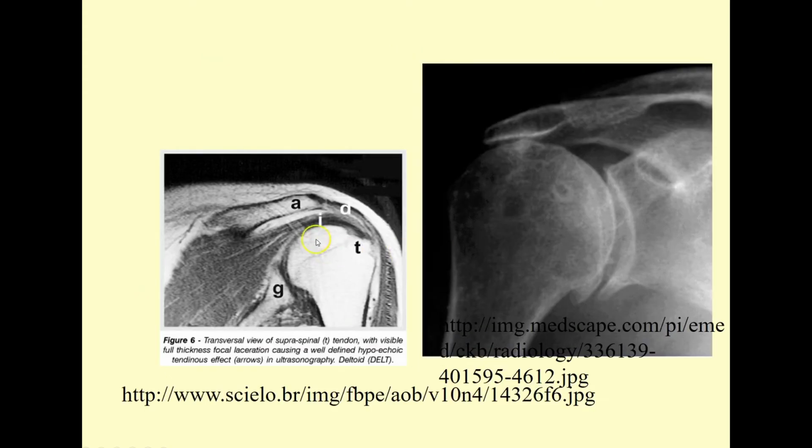Again, here we have an MR image. We've got the acromion here, we've got the deltoid here, supraspinatus coming through here, glenoid, and look at the offset. Here's the inferior part of the humeral articulation. Here is the inferior part of the glenoid. This is cephalad, and that's closed down, compressed. These are the conditions typical of impingement syndrome.